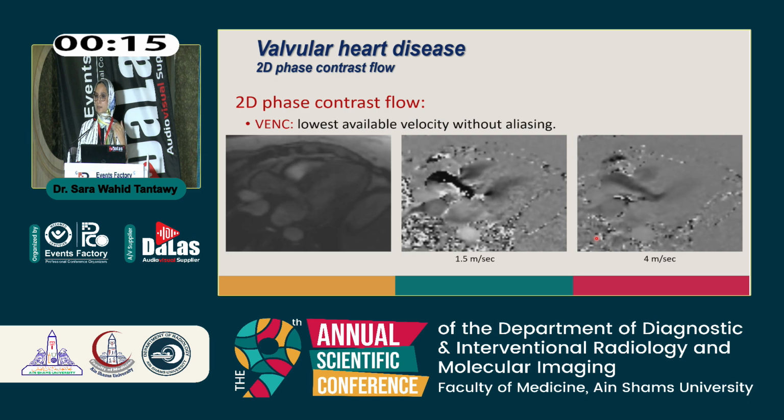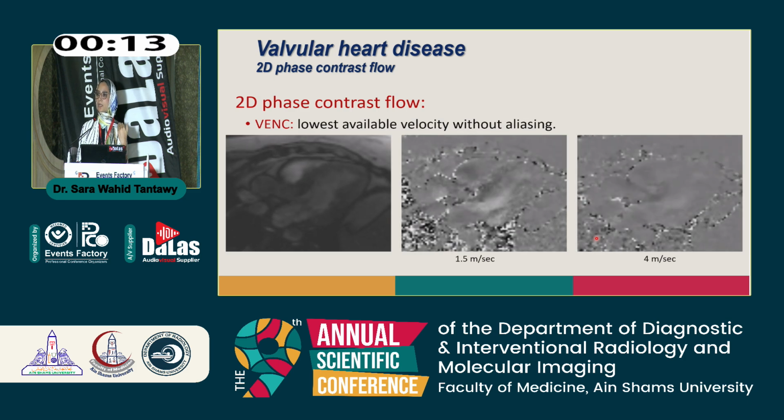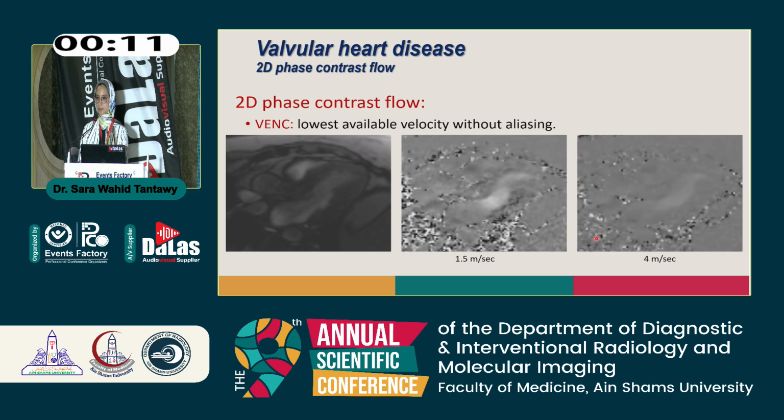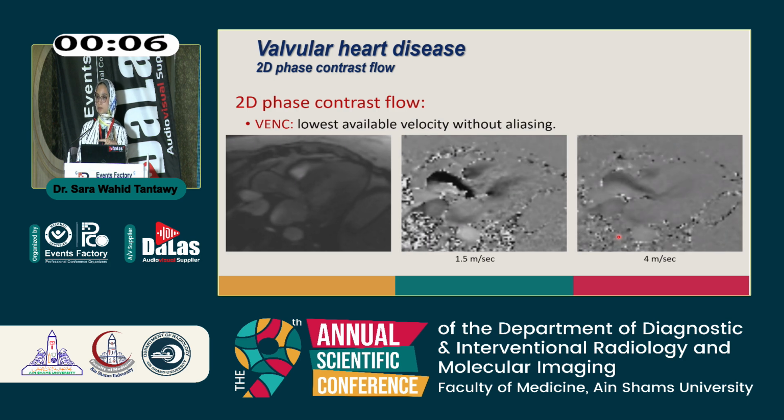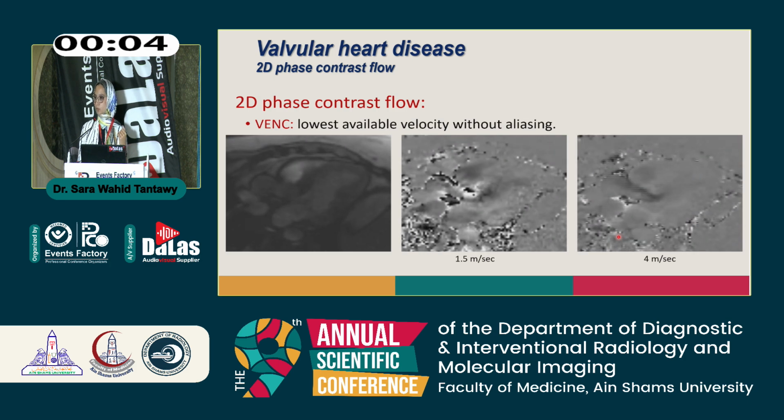And the more we increase the VENC, the more we acknowledge that there is stenosis in this region. So for example, in this patient, it reached 4 meters per second, which means that there is subaortic stenosis at this region.